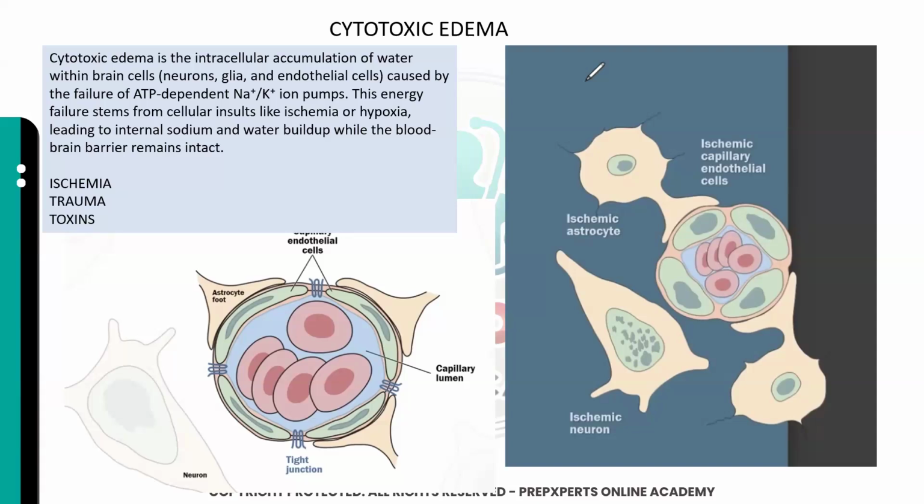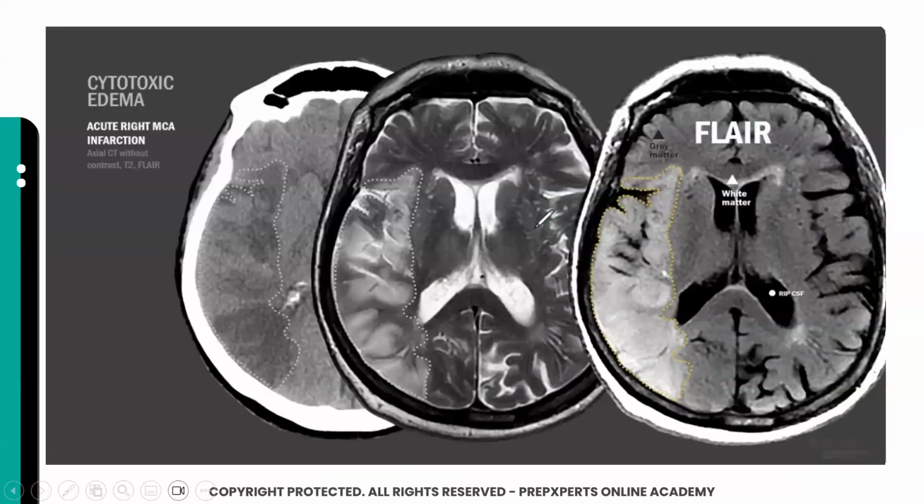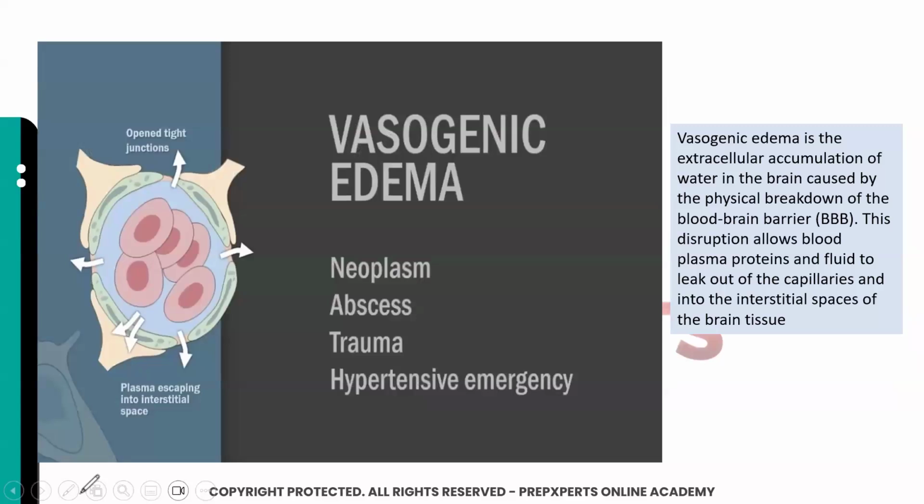Okay, so this is typical picture of vasogenic edema, and this was due to brain metastasis that can be seen here. So this is your subcortical T2 hyperintensity. Cortical ribbon is still intact here. In the infarcted tissue, this won't be visible, and this is your lesion that is causing this edema.